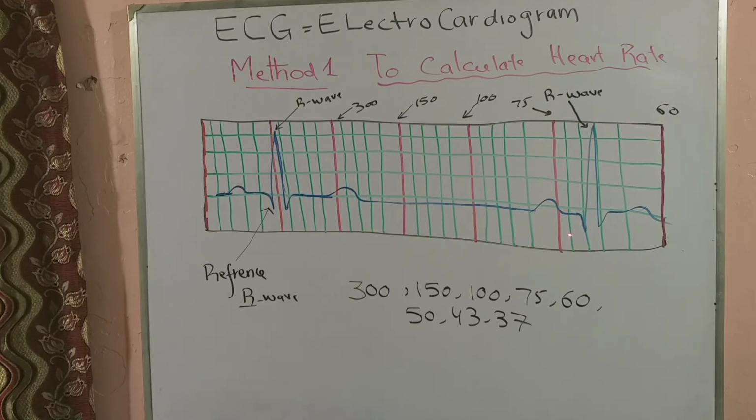We are not to be exact about it. Why? Because we want to know whether the patient is having a normal heart rate, a bradycardia or tachycardia. So here the heart rate is around 72. This is the easiest and most offhand way of knowing the heart rate.